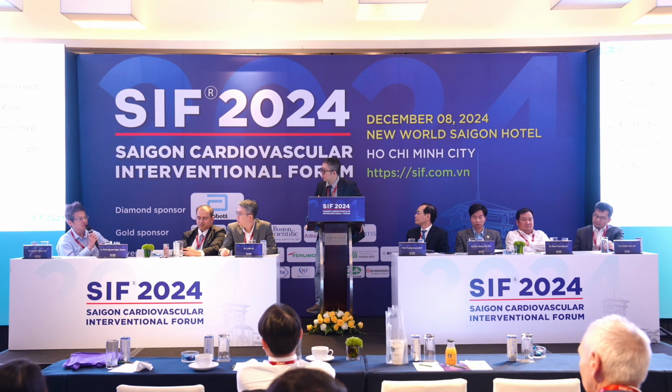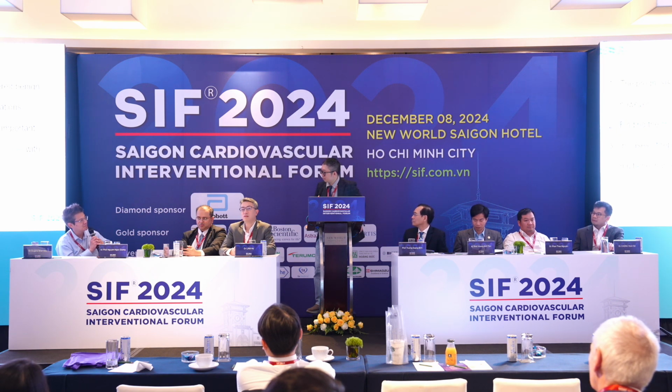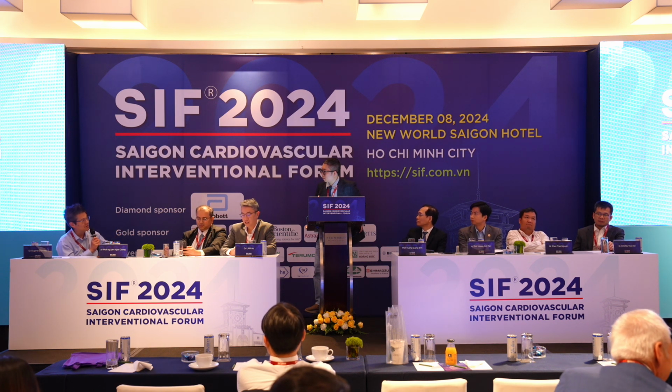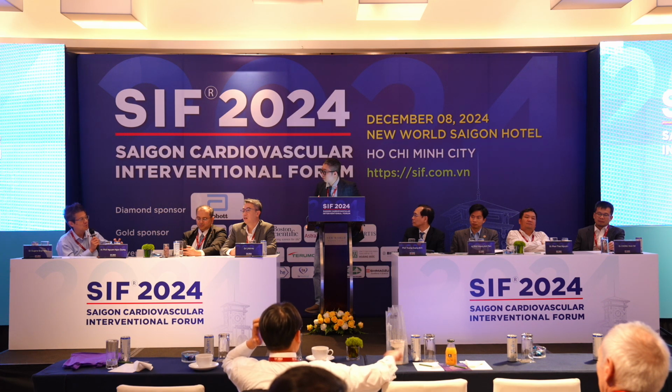Reading the IVUS is not so easy. They say a good IVUS is easy to read, but a bad quality IVUS is very difficult to read. And looking at whether you're in the false or true lumen with Volcano IVUS is actually very difficult. But it's also very easy if you've done it a lot. If you have a false lumen in a distal LAD, the false lumen is going to be the bigger lumen. If your IVUS is in a true lumen, it's going to be in a smaller lumen, because in a distal vessel where there's a true and a false lumen, the false lumen is always much bigger than the true lumen. Your IVUS in the distal is in the big lumen, which brings me to the conclusion that you stented into the false lumen, and that's why you cannot get better flow.